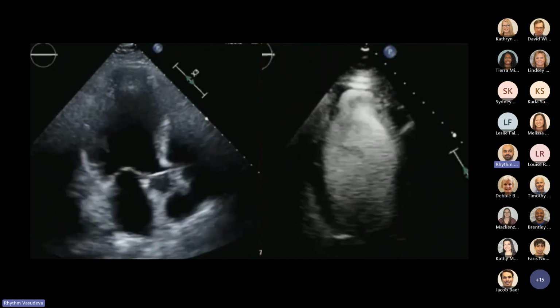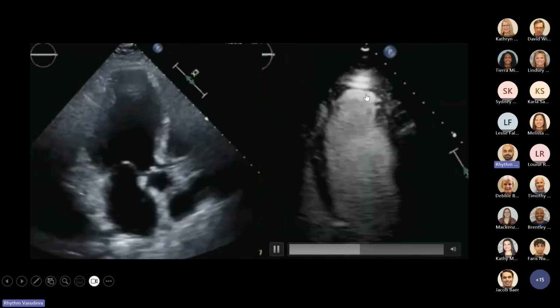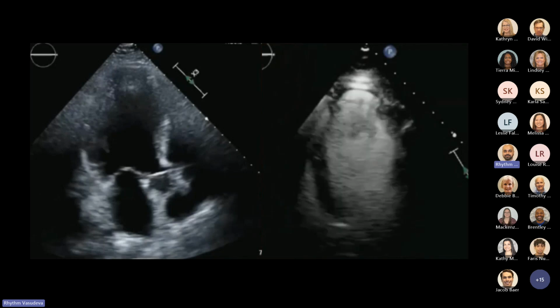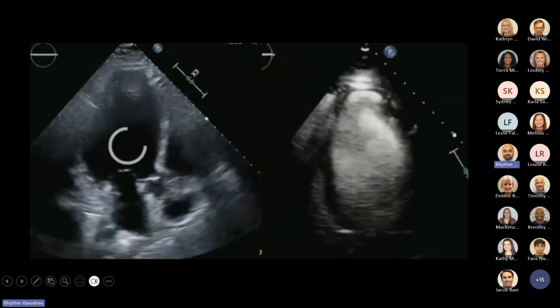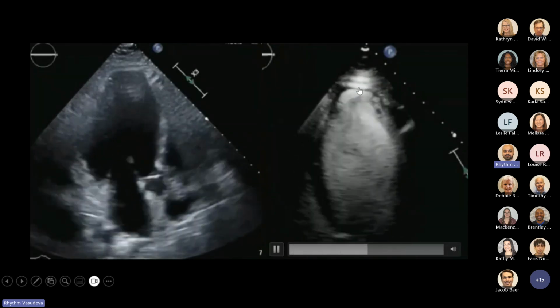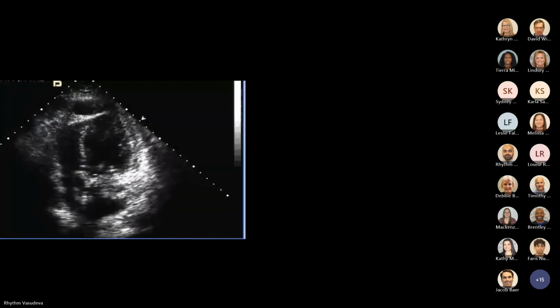Yeah, perfect. So I hear apical aneurysm, and you look at that area. I think Dr. Beaver gave a recent conference talk on differentiating aneurysm from pseudoaneurysm, and that's very helpful for this talk as well. You can also see the apical wall looks pretty thinned out, so that's important to note because some aneurysms can pose risk for rupture, though it's rare.